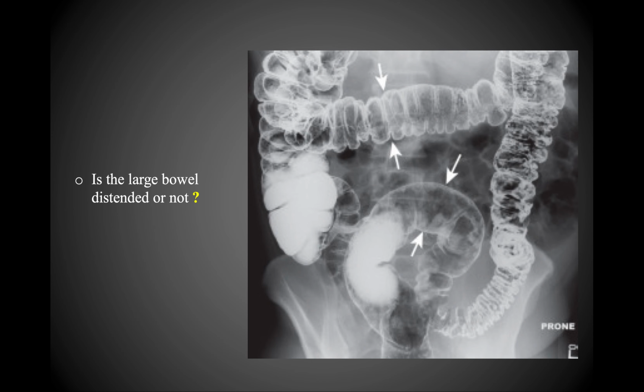But for right now, just study this and get a sense of what the cecum normally looks like, what the ascending colon looks like, the hepatic flexure, transverse colon, descending colon, going down into the sigmoid colon and the rectum here. Clearly, you get a pretty good sense, I think, of what the large intestine normally should look like with this barium study.